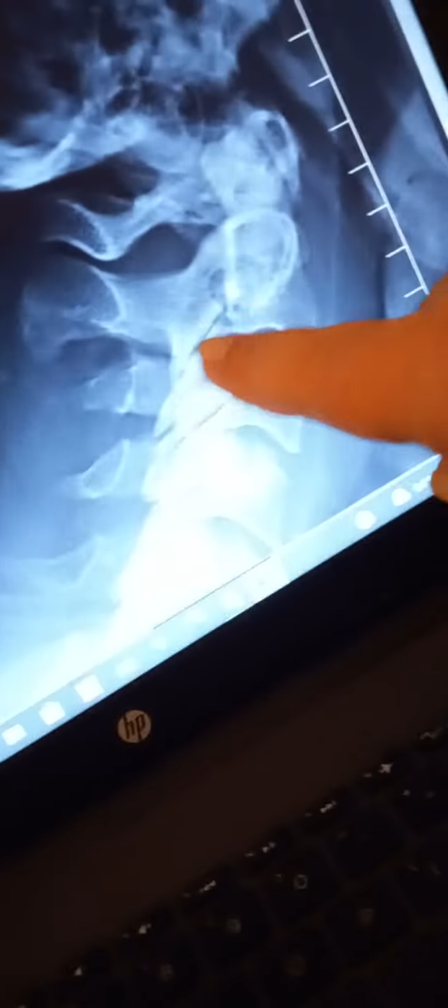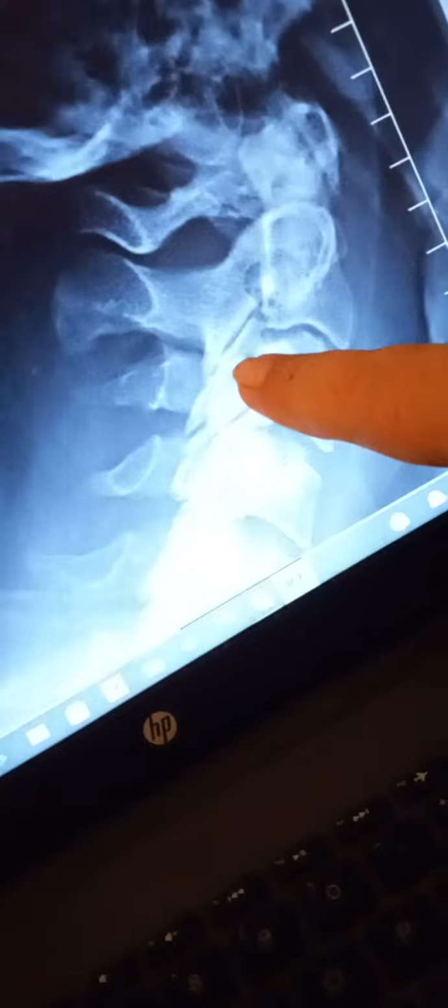See, there's no, I call it my Zorro mark, whatever you want to call it. But you can see the fracture. See, this is pushed. See the Z? They don't have the Z. I got a Z. The Zorro mark.